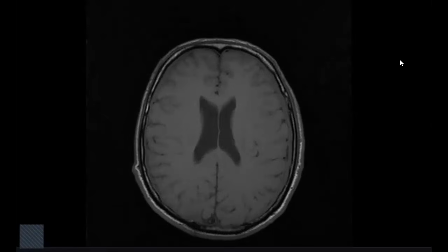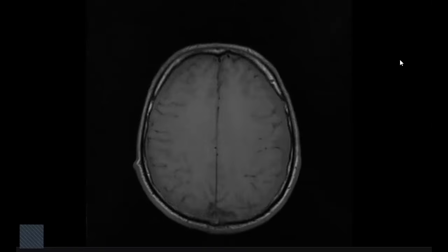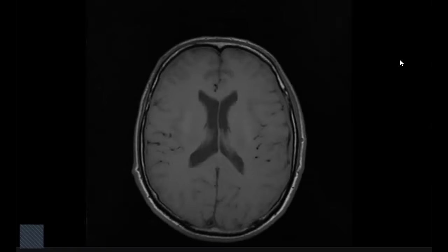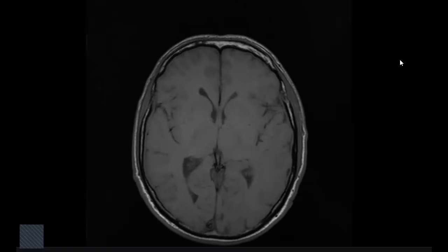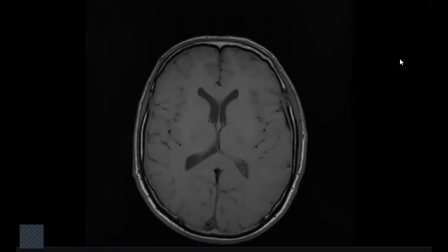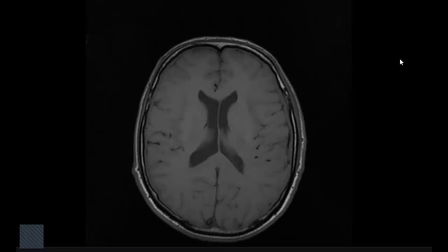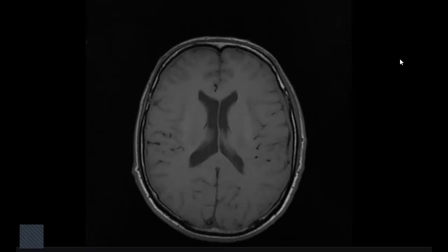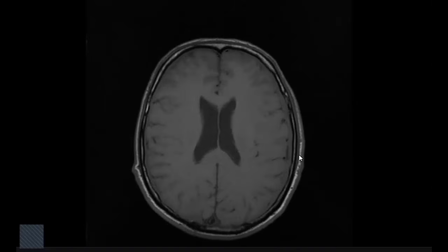Okay, what are the check areas in the MRI brain T1 you are looking for? I'm trying to look for the superior sagittal sinus if there is any evidence of thrombosis. Okay, no thrombosis. Any other abnormality? I really couldn't appreciate. Maybe this is abnormal. In the sulci, it appears to be hypointense, but this could be the blood vessels in it. Signal voids of the blood vessels.